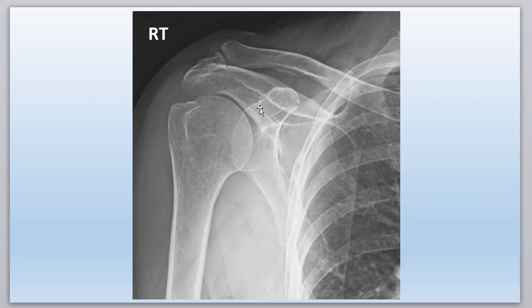Some older texts, I've seen, call this the lateral angle of the scapula, and you're thinking, well, I don't see any angle. It looks like a flat structure, and that's exactly what a lateral angle is. It's a truncated angle where the angle was maybe embryologically more pointy and it got squished flat. But it's better to call this the glenoid cavity, which comes off the head, which comes off the neck, which is this thick part right here underneath the glenoid.